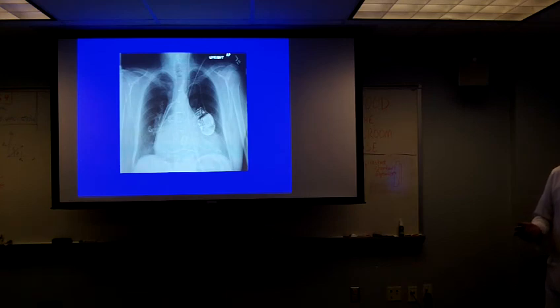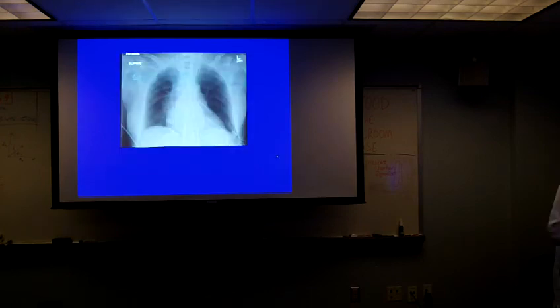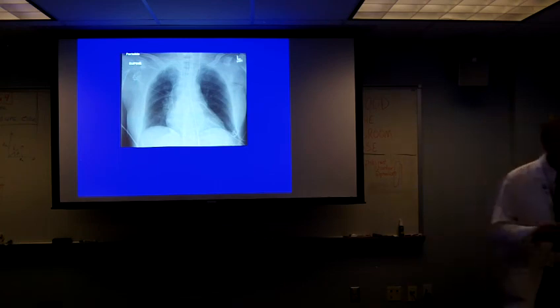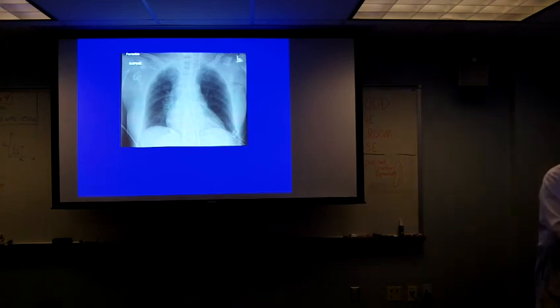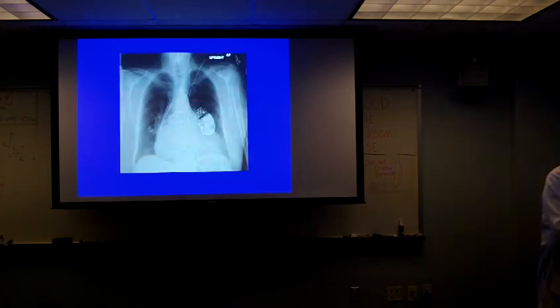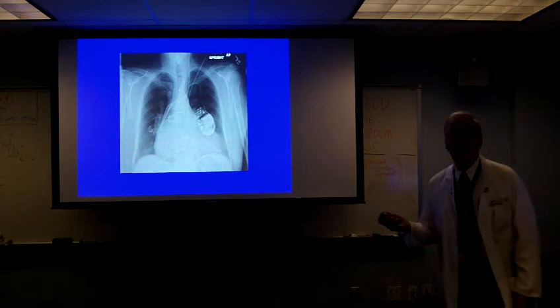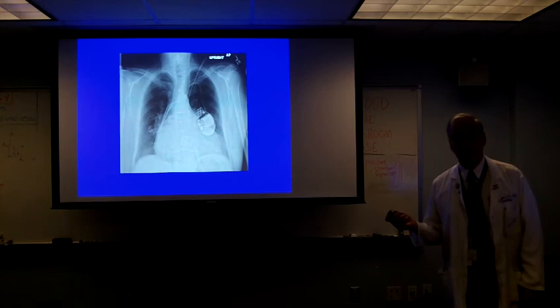That's the pre-op film here, and this is the post-op film. Is that the same patient? No, because of the valve and all that stuff. Well, one doesn't have a pacemaker. The post doesn't have a pacemaker. Yeah. That's not right. Yeah, these guys don't come out unless you do a heart transplant.